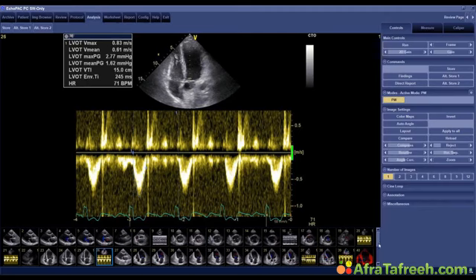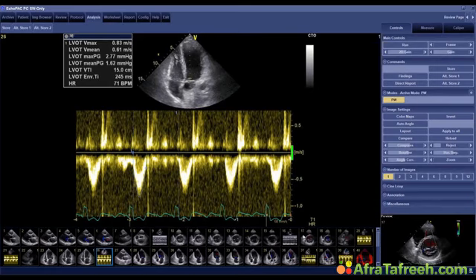Okay, so coming back to this case, I want to wrap up this case, or at least this first part of the case, in the sense that he has very severe mitral regurgitation, which severely impairs his prognosis. He has low output failure, basically, maybe because of MR and because of poor ejection fraction. But he does not have such severe pulmonary hypertension, and his right ventricle is still okay. Still, the patient was very symptomatic, and the question was, what can we do with him? He was under full heart failure treatment, but my question to you later will be, what can we do with the patient?